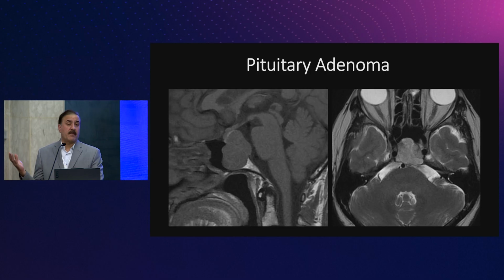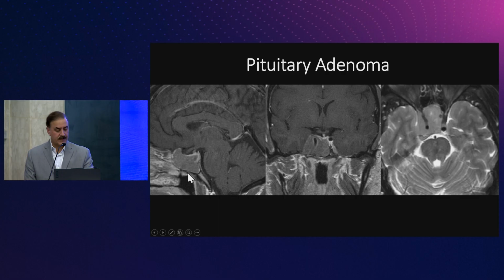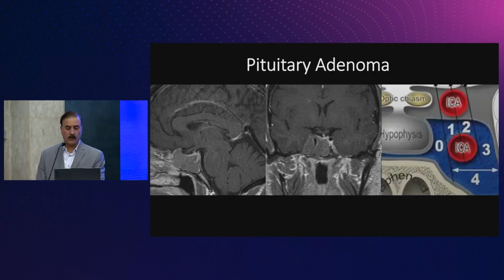Typical diagnosis: pituitary macroadenoma with suprasellar and parasellar extension. Very easy diagnosis, but that comes in the realm of the central skull-base pathologies. Here you can see a pituitary adenoma with a larger infrasellar component growing into the sphenoid sinus, as well as parasellar extension completely encircling the carotid, but you can still see the maintained lumen of the carotid artery, which is typical for a pituitary macroadenoma.